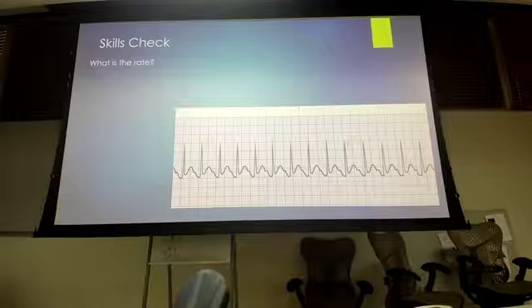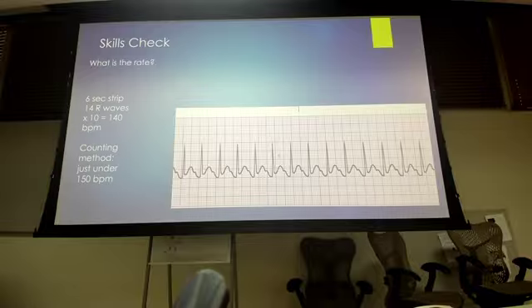Again, we're looking at averages. Could you do the counting method? I mean, could you do the 6-second method or 10-second method? 6 seconds. Yeah, we don't really have enough information. We only have one line. That's not gonna help you. That's fast, right? There's one on each side. Cut off. Very lightly. They're in there. Oh, I see it. Technicality. Well, we could. We can count them all up. 1, 2, 3, 4. See how long that takes? It takes forever.